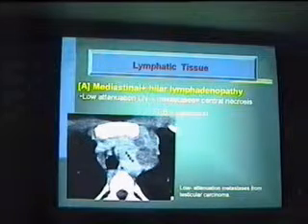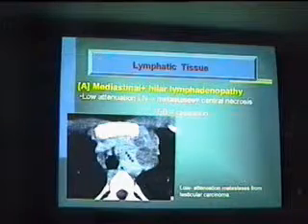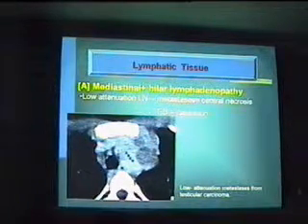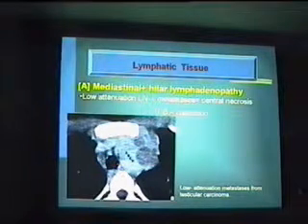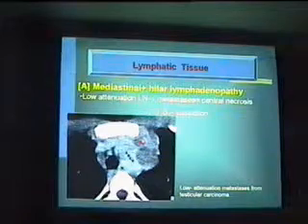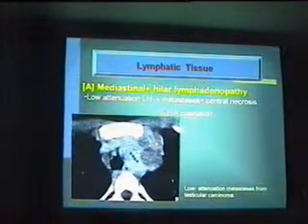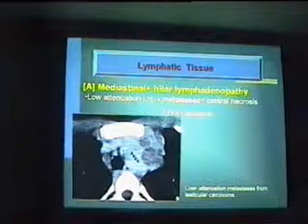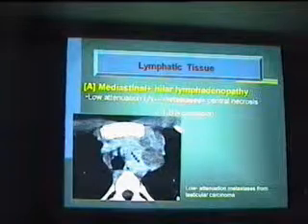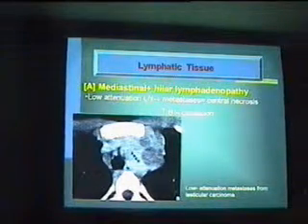تاني هنا برضو ادي sternum. يبقى انا هنا في البريفاسكولار اريا. يبقى this is the left innominate جاي يعمل لي مع الرايت السوبيريور فينا كيفا، وده الازيكس ودي التراكيا وده الاسوفيجس. and this is the aortic arch وبارا aortic عندي mass with areas of breaking down. Commonest mass here, it's not arising from the aorta definitely. Commonest mass here is tracheobronchial lymph nodes. I'm sorry، para-aortic lymph nodes.